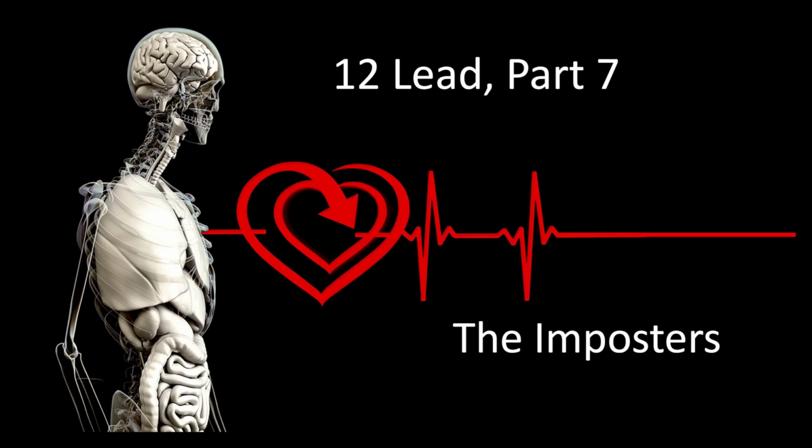Welcome to 12 Lead Part 7, The Imposters. I'm going to talk a little bit about things that might show up on a 12 lead that can fool people into thinking they're seeing evidence of an ST elevation MI when actually there's something else going on.